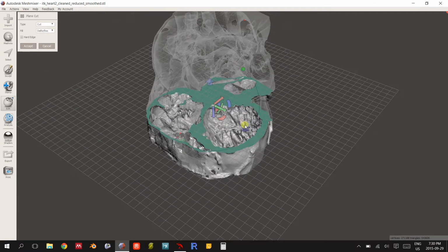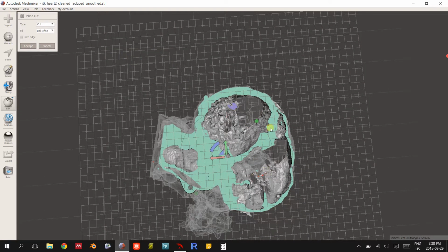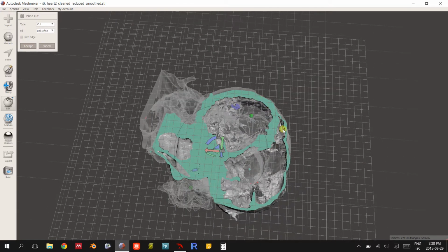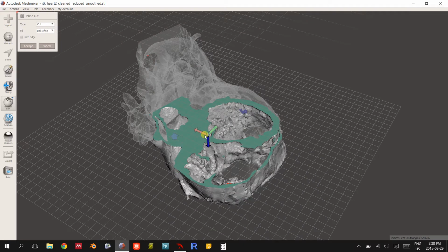You can see the ventricles completely well defined, so this would be the left ventricle, right ventricle. There's the septum. It's a little bit skinny here. That's my fault probably, but it's defined. The wall around the heart is continuous now, so there's no weird elements that are just missing, or it looks like there's been parts of the heart removed.